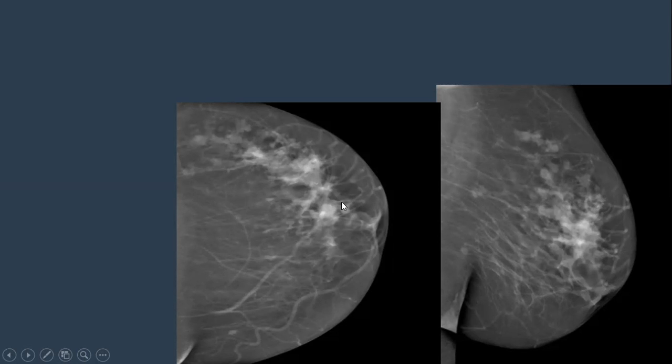Yes, so associated with asymmetry. Yes, excellent. There are multiple focal asymmetries occupying the whole area or giving global asymmetry due to multiple nodularity. You can describe it in any area. Even if you look here, obviously there is increased vascularity along with distortion and a band going toward the nipple with nipple retraction.